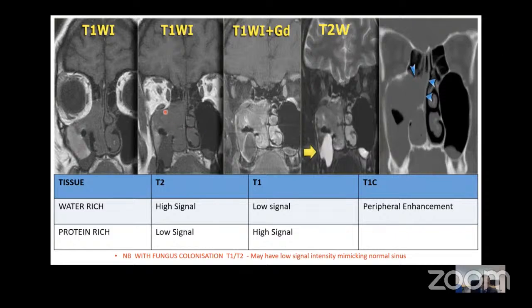Now, if the lesion is a solid mass, how do we differentiate a benign lesion and a tumor? This is where a T1 GAD comes into the picture. If the lesion is benign, it will show peripheral enhancement of the lesion. On the other hand, if it is a tumor which has increased circulation or increased vascularity, the whole lesion brights up. So this is a simple way that I use to distinguish between tumor, benign lesion, secretions, and fluid retention.